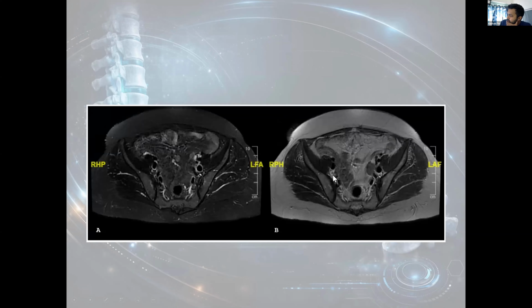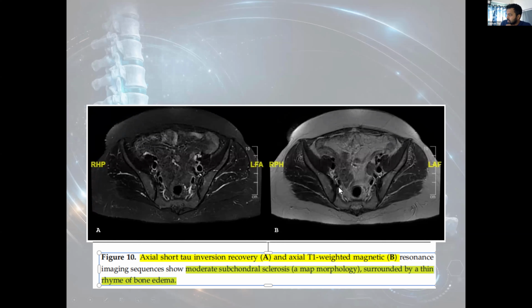This is another image where you can see the SI joint is so widened. Here it is pretty okay, but here the sclerosis has occurred. This is almost grade 3, where the joint space is very large. And another thing you want to see, if you zoom here, there is a black area here. So the joint has ended here itself. This is the black area. This is maybe mostly the erosion, the sclerosis. Sclerosis has happened. That is why it is black.